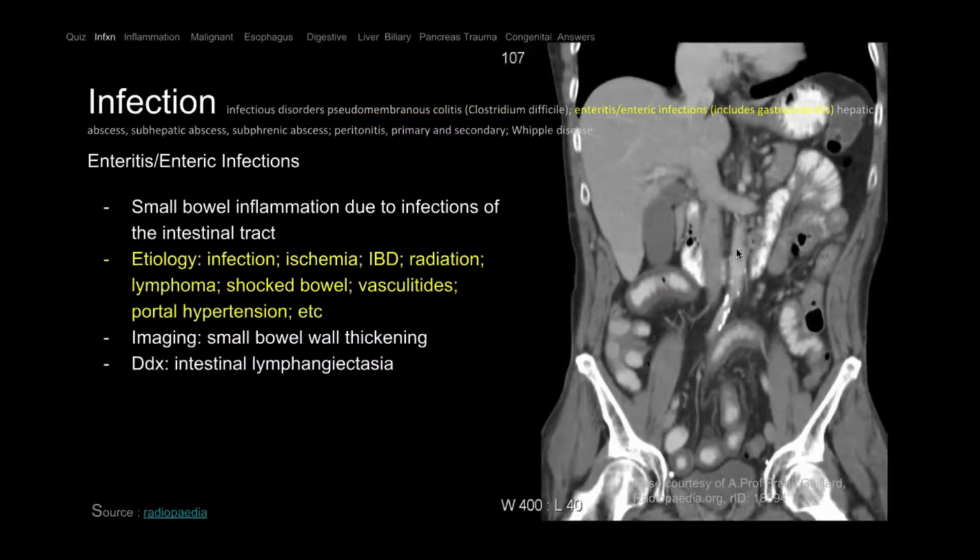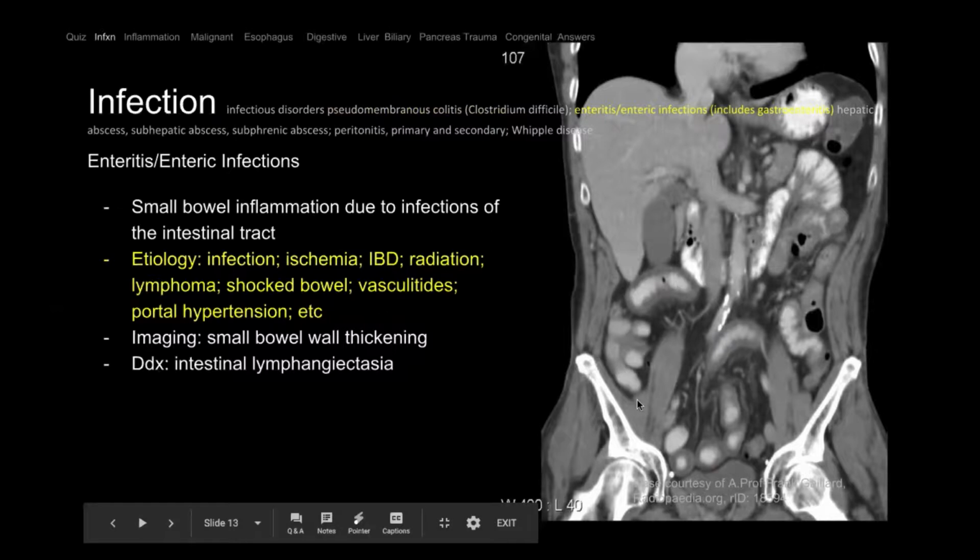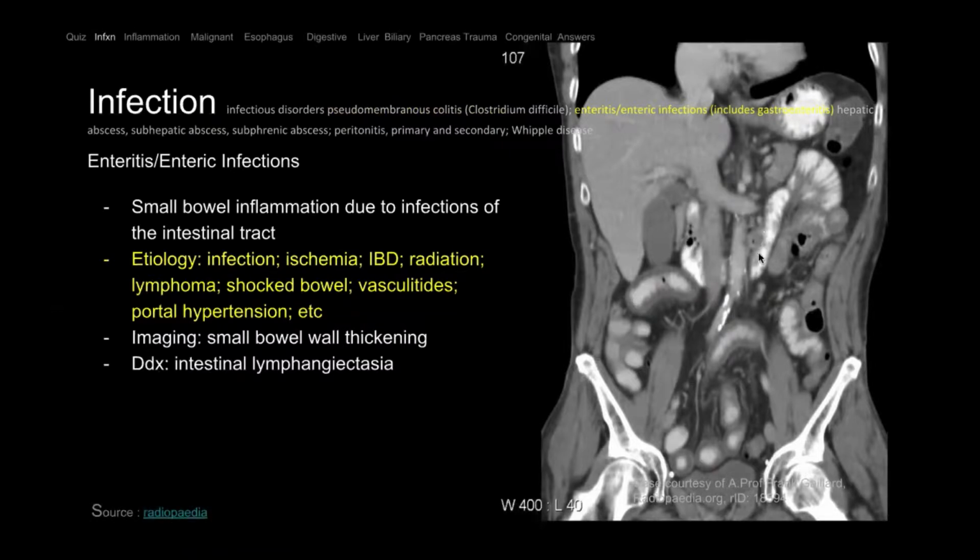What segment of the bowel looks abnormal? So this one, a small bowel is abnormal. So here, this is normal bowel. Jejunum is here. Jejunum is the proximal bowel. The ileum lives here. That's the second half of the bowel. They're in different locations. The duodenum rotates. I don't know if you can see it here, but the duodenum is sort of a C loop.